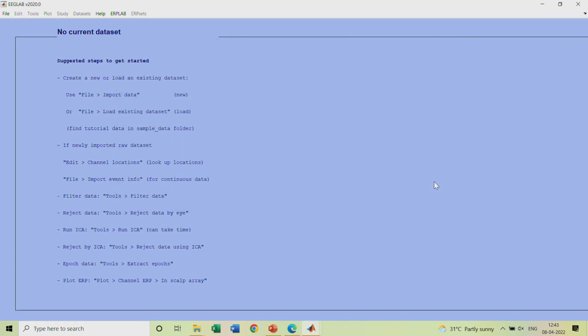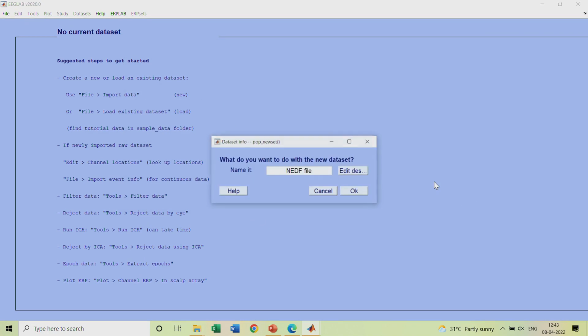It takes some time, because that experiment was repeated for 800 standards, 100 distractors and 100 targets. What are standard, distractor and target? I told you: standard is a small blue ball, target is a big blue ball, and distractor is a checkerboard, which distracts you from identifying the target, the big ball. The subject was asked to click whenever the big ball came.